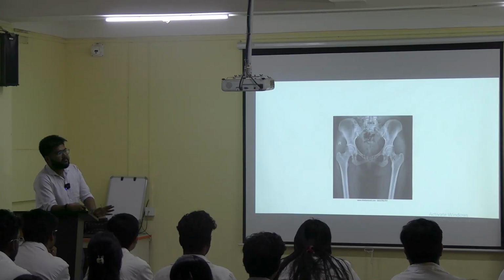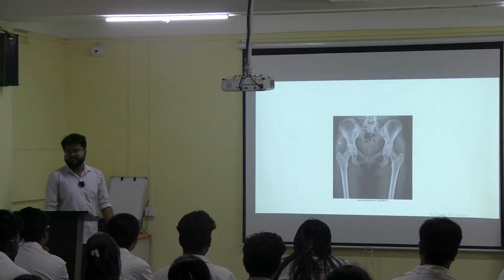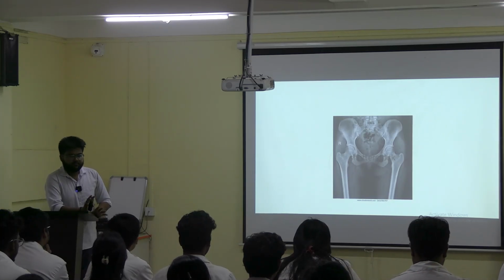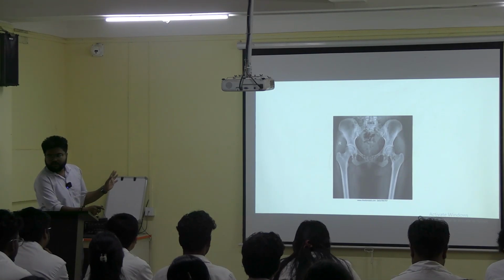Always remember, in anatomy this is the normal X-ray. Abnormalities or any kind of pathologies are not given from now. Just simply identify the structures, means identify these bones. That's enough for you. So this is the first X-ray, a very important X-ray. Now identify all those things.